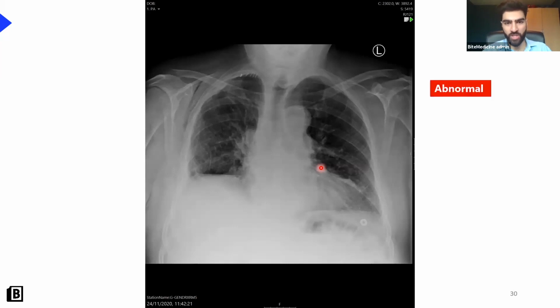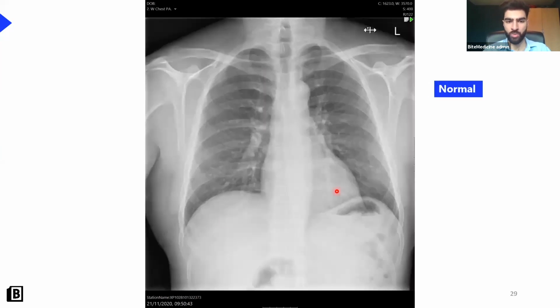Good, abnormal. So airway looks fine. The lungs, there's something a bit odd here. Okay, we've lost the right hemidiaphragm. It's blunted, isn't it? There's something a bit odd going on over here as well, in the lungs. So there's something strange going on here. The diaphragm doesn't look quite right. This is an abnormal film. So compare it to the previous normal.